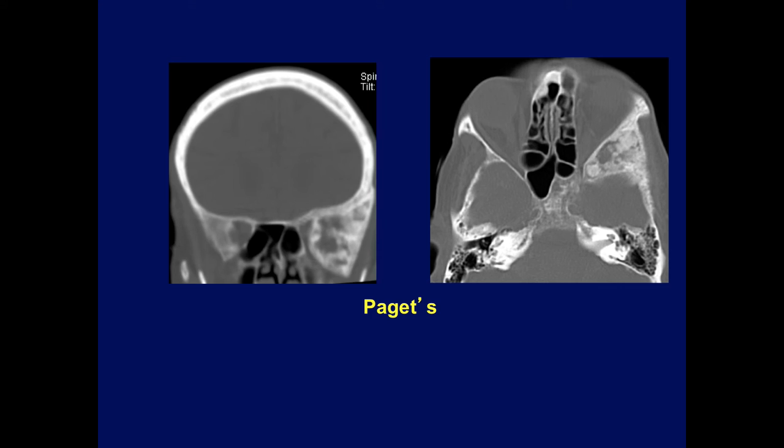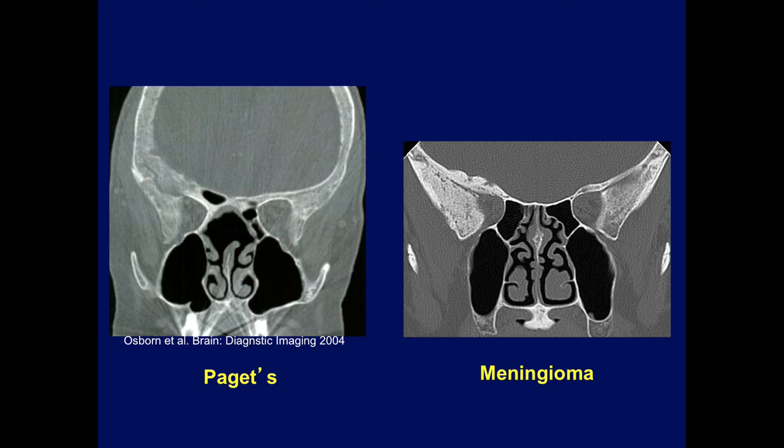NF, I don't think this patient had NF. Here's a case from the literature showing what they call the Paget's. Looks somewhat similar to that, and this is one of our cases showing a meningioma. So there's definitely a distinction between the two.